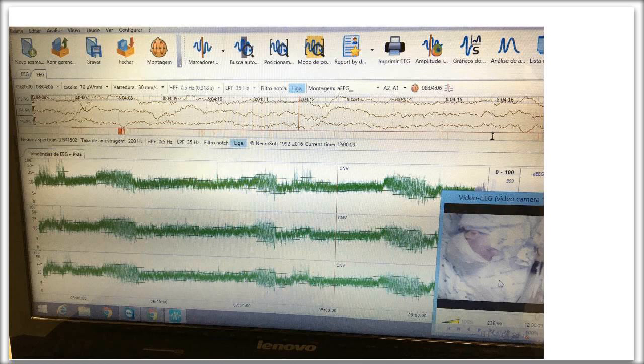I don't think that there's any other concern. I have seen it in babies withdrawing. Sometimes they're hyper irritable and you see these margins a little elevated. And certainly if the kids are 6 or 8 weeks old, we see these margins. But again, at 6 and 8 weeks, we don't see these beautiful sleep-wake cycling that I see here. So I think these are sleep-wake cycling.